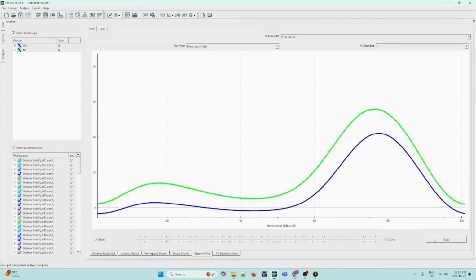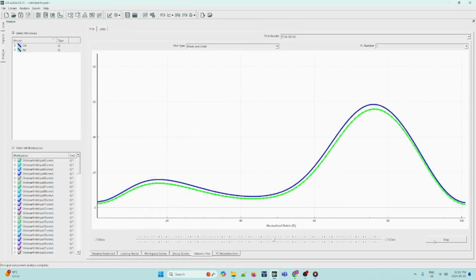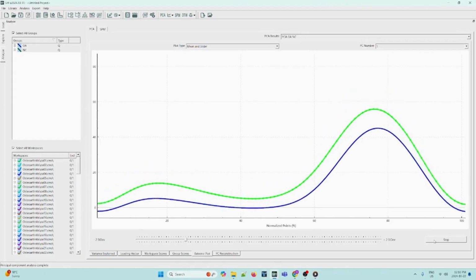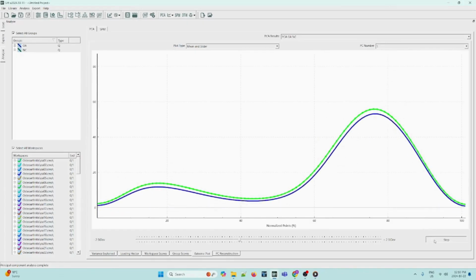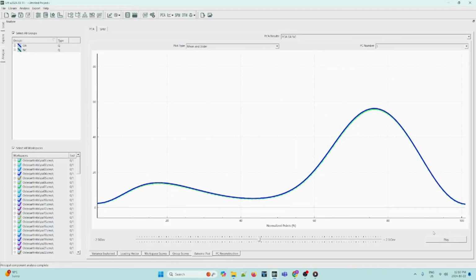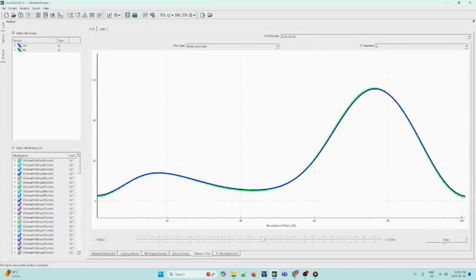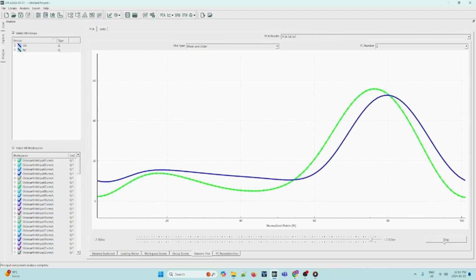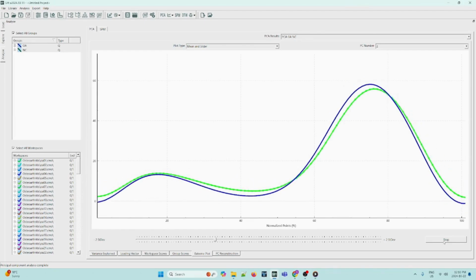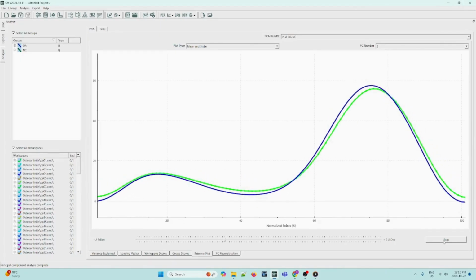For PC1, this variation shows an offset in data, likely due to things such as the difference in posture, and this may not be as relevant for answering our question. We can hit stop, and we can now switch to PC2 and play the animation. And the differences become more pronounced during the late stance and mid-swing, providing more meaningful insights into the data. This tool is useful for understanding how each PC contributes to movement variability.